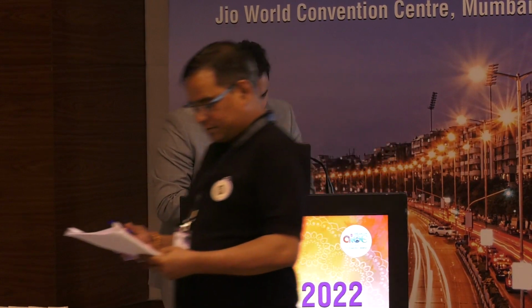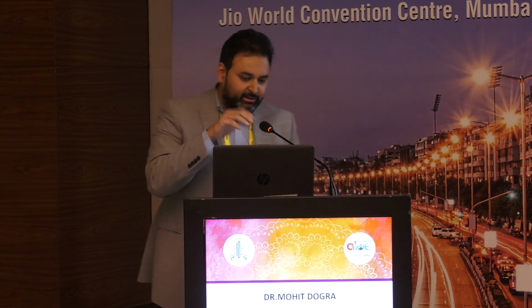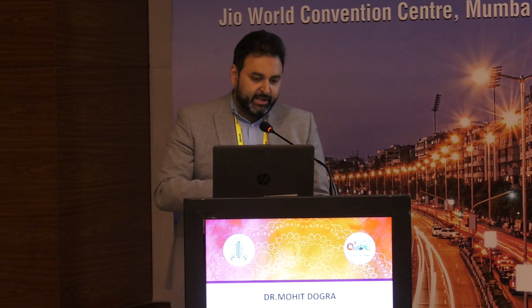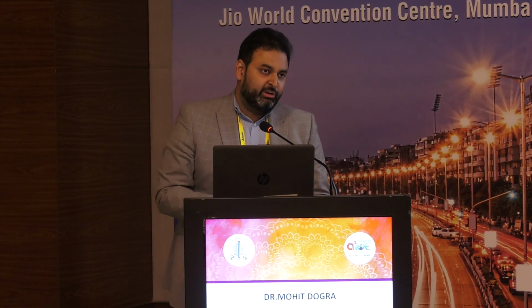Thank you, sir. And I'd like to thank the entire panel for this opportunity. I have 6 minutes, so I'm just going to try and keep it short. It's going to be fairly basic, so let's see how this goes. If you want to look at grayish pathologies in the macula, I substituted the term membrane with pathologies. So this is a quick checklist of conditions that you want to look at.